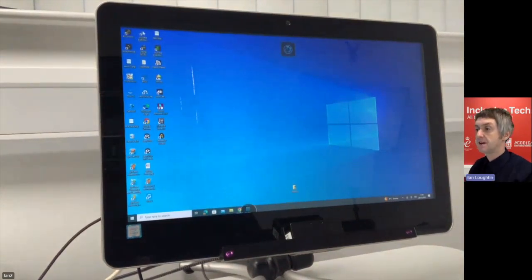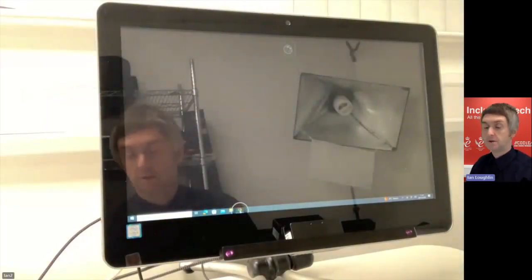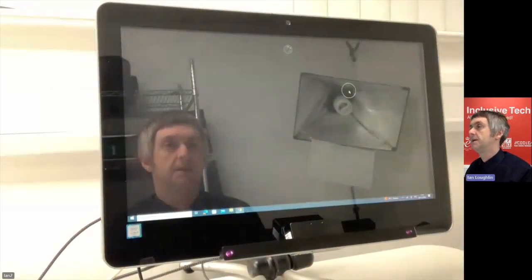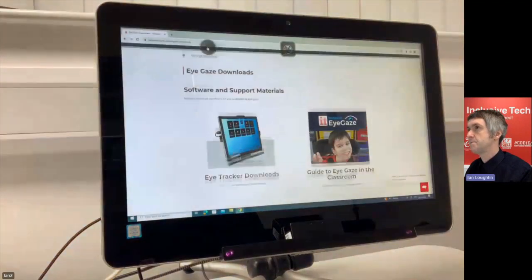So I think that's about time. That's all the time I've got to show you this software. But certainly, if you're interested in that, then you can download free trials of that software available on our website. If I just go to our website here and show you.